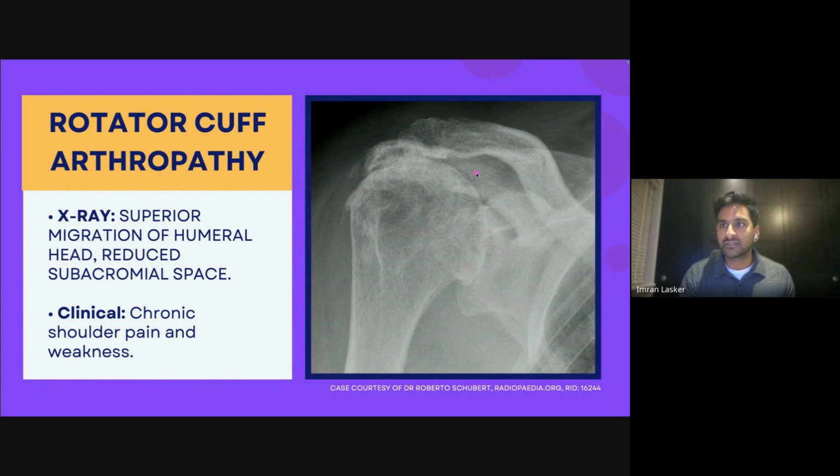But let's say you've got missing tendon, and that results in instability of the shoulder anyway. Then you can start to get something called subluxation of the humeral head towards the top over here. Now there's nothing sitting over here. That's all gone because the tendon's ripped and pulled away along that. So you've got this touching this area, and you get osteoarthritis in this subacromial area and the humeral head as well. And you can see this is not nicely lined at all anymore, right?